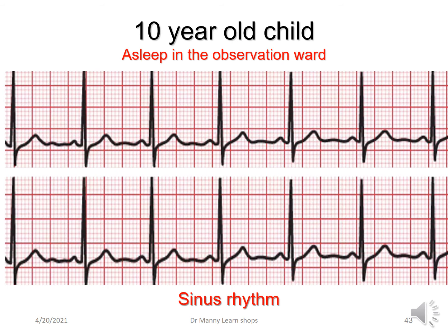Normal sinus rhythm basically means that you've got an ECG complex that meets all the criteria. Small P wave, according to the criteria, narrow QRS complex at a rate that is specific. If you, for example, had abnormal sinus rhythm, it may basically mean that the rate is still between 60 and 100, or whatever the age group is for that particular person, but it might be wide complex. You might have a funny shaped P wave. The T wave may be flat or peaked. It's not normal sinus rhythm. Sinus rhythm that's normal meets all the criteria.